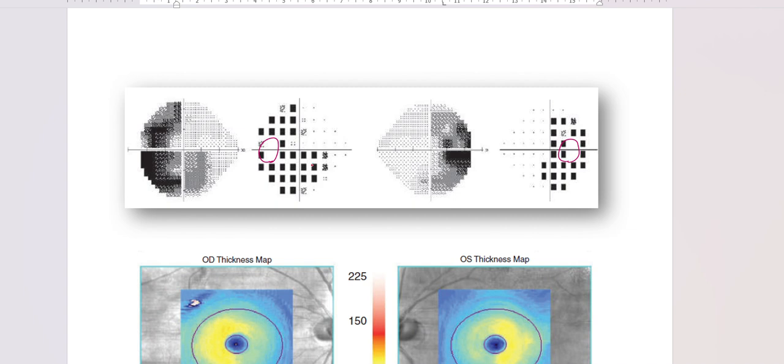So we got different answers for these questions. Again, candidates assume that this is combined optic neuropathy and retrochiasmal lesion. Retrochiasmal lesion from the hemianopia, and the horizontal lesion was an associated optic nerve lesion or optic neuropathy. So please don't assume anything.